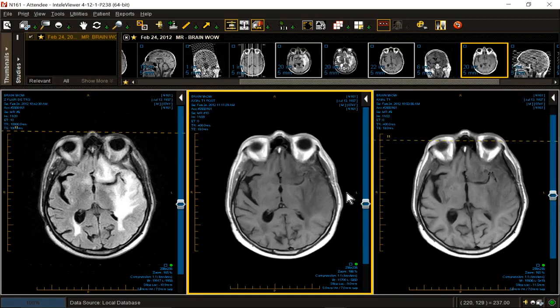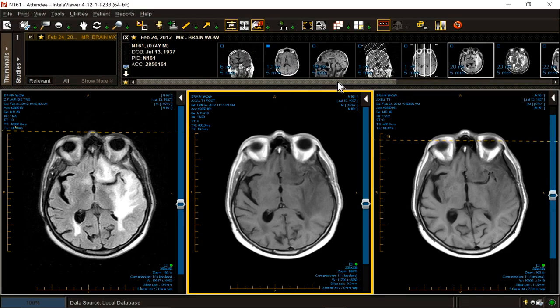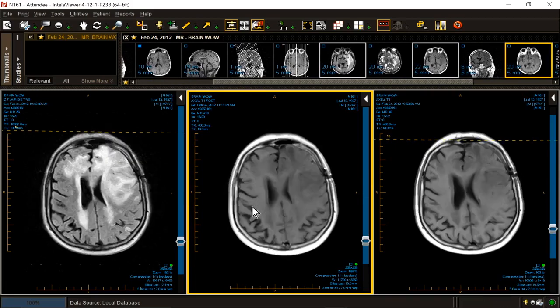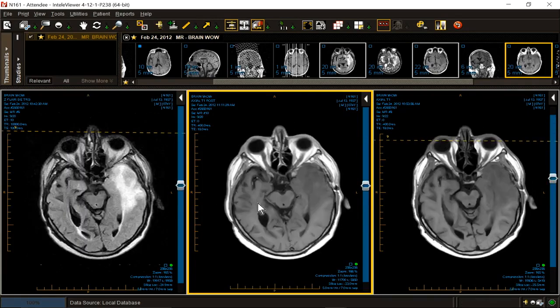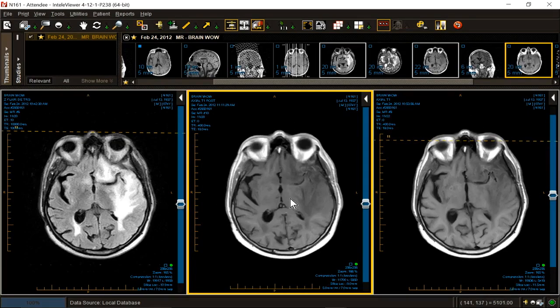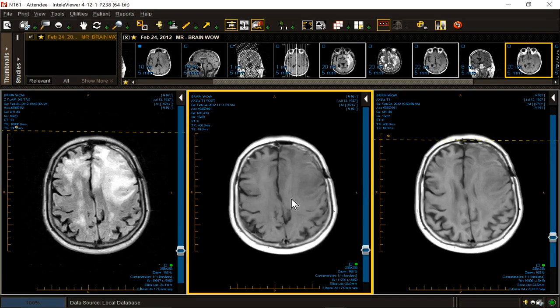So you'll have very extensive cerebral blood flow on first pass imaging. But on equilibrium phase imaging, which reflects blood-brain barrier, not so consistent. But it's still an aggressive lesion. Do not have diffusion imaging on this case. What else might we comment on? I've already said no blood. Necrosis, none.